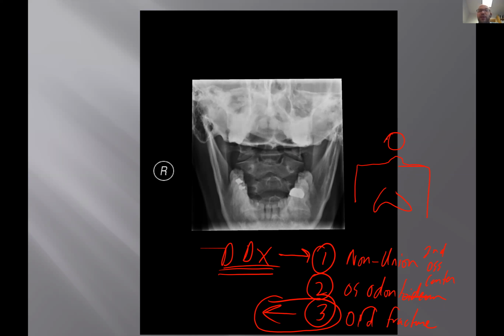And they're massively unstable. You definitely want to get flexion extension views. Even for this case, I would get flexion extension views. That's why this is so shocking to me. This is a true non-union going down below in there. So if this is an os odontoideum, this is a developmental os odontoideum. So great case. And on the flexion extension views, then you're looking for ADI greater than 3 millimeters?